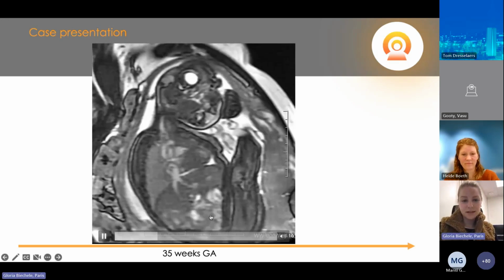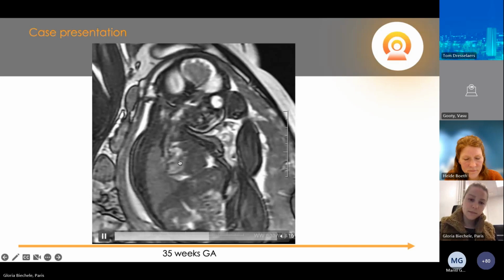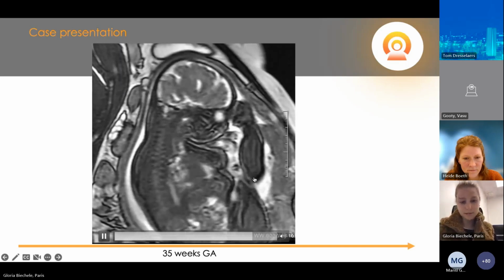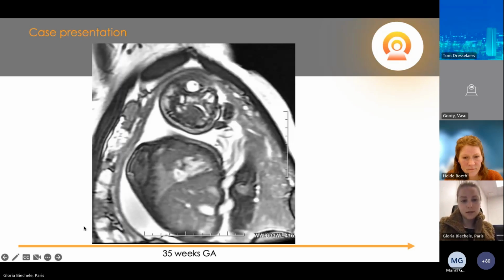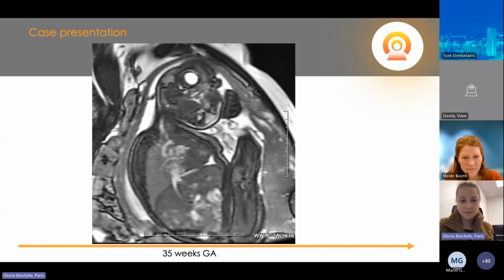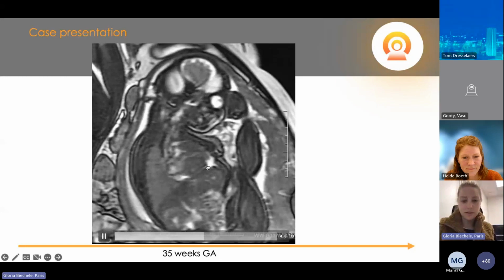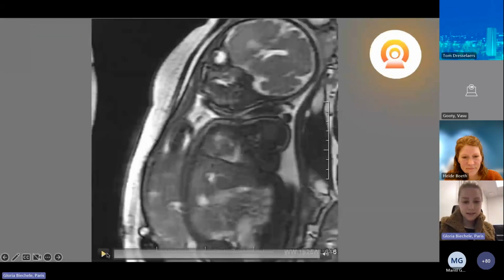The mass is appearing here with some blood, which is passing beside or above the mass. I'm going to wait until it shows up once again. The mass is here at the basis of the left ventricle. After that, same in a short axis.